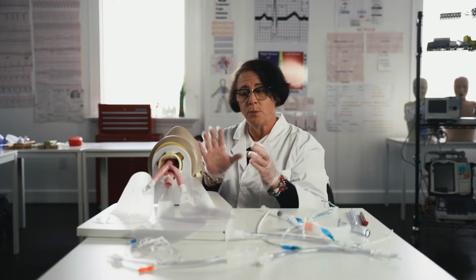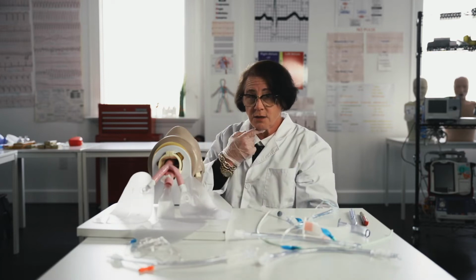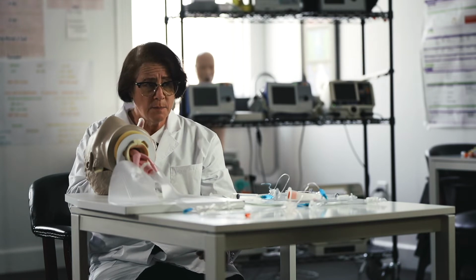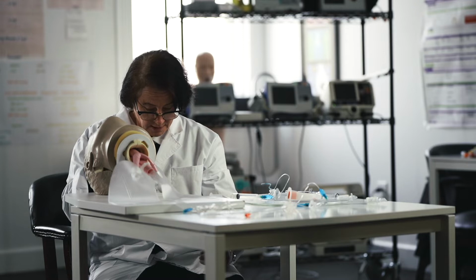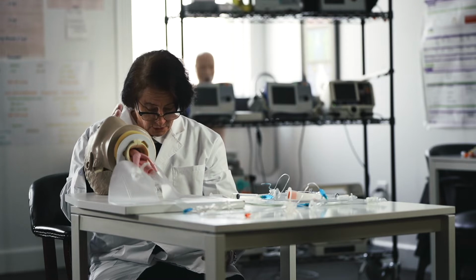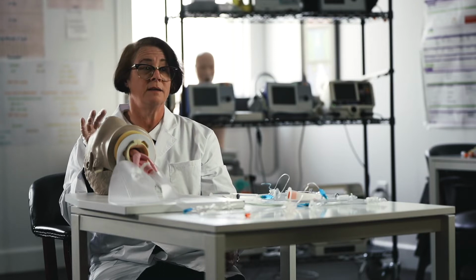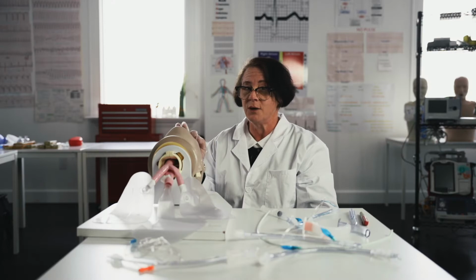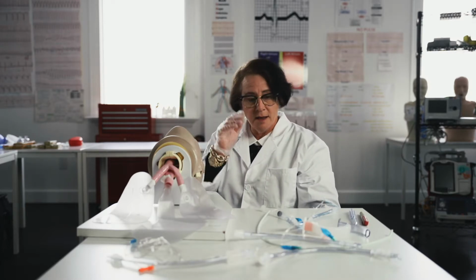As long as their airway is open, when you give them a breath, the chest will rise. So this goes to my lungs. I've opened my airway. If I tuck my chin to my chest, I completely close my airway. This goes to my stomach. So if I give them a breath like this, it's going to go to their stomach. If I give them a breath like this, it's going to go to their lungs. And in the middle, it could go stomach or lungs. So when you give them breaths, you only want it going to their lungs. You should see visible chest rise.